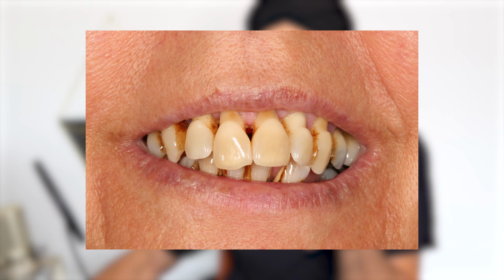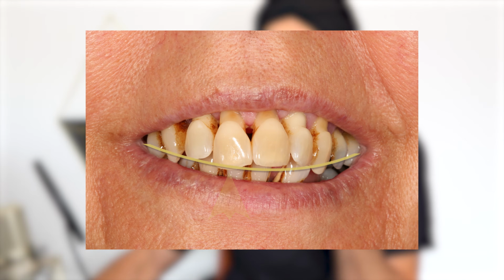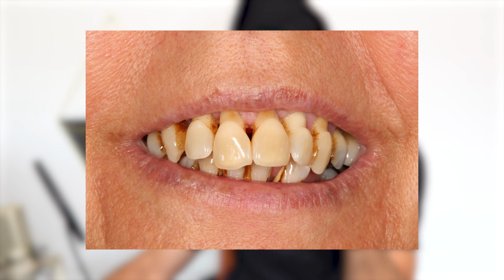So again, let's go back to the aesthetics, because I do a lot of planning from a photo, something like this. I'm looking at the look of the smile. So I want the bottom edge of the teeth here to follow the lower lip. You can see that these teeth are too long at the back. All these three teeth are too long. These front two teeth, the length of them is really, really important to get right.